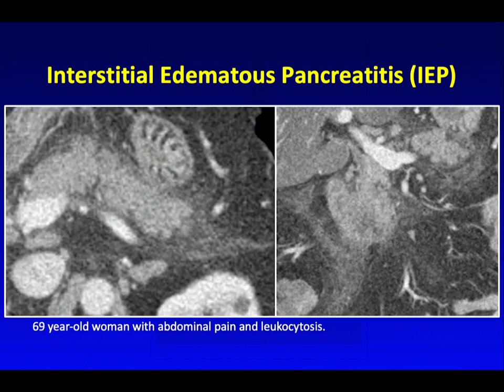And sometimes these cases of pancreatitis may be a little bit more subtle, as in this case, all you see is a little bit of peripancreatic soft tissue stranding and not much else. Not much fluid or fluid collections around the pancreas.